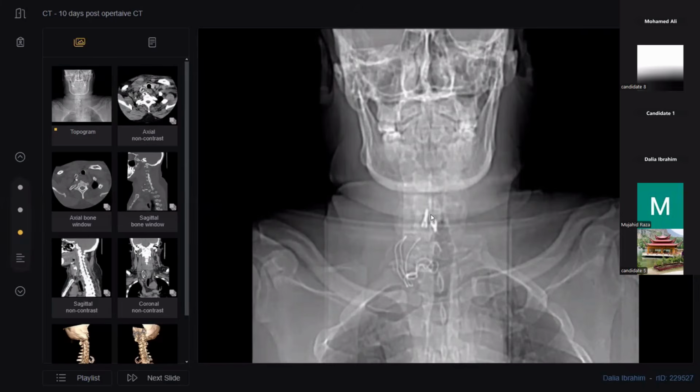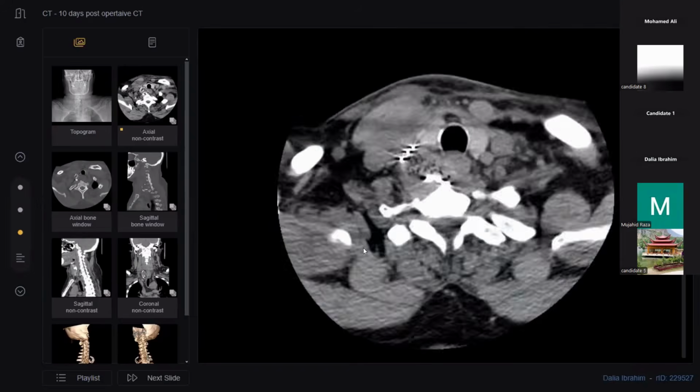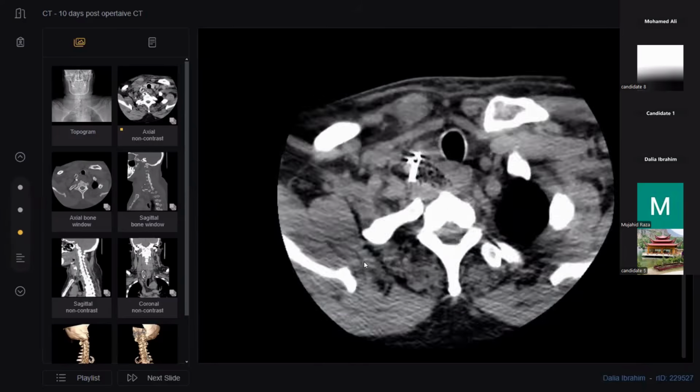So in this region, the zero profile device they used to insert in the C5-6 disc. Okay, but this actually was very strange for me. This could be a foreign body. This could be something left by the surgeon. What we call gossypiboma. Yes, amazing. You are very, very clever, Sadiq.